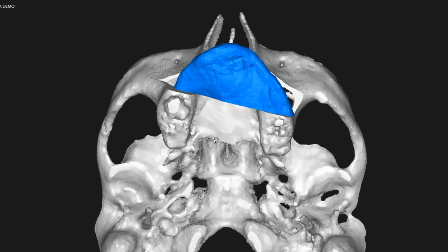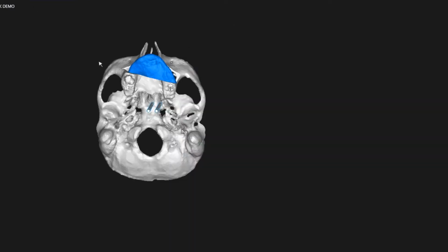And have you got any broader? Do you do any broader, sort of fatter but shorter implants? Yeah, I can bring in any size that you'd like. Let's try length 8 millimeters and 3.0 width. Okay.